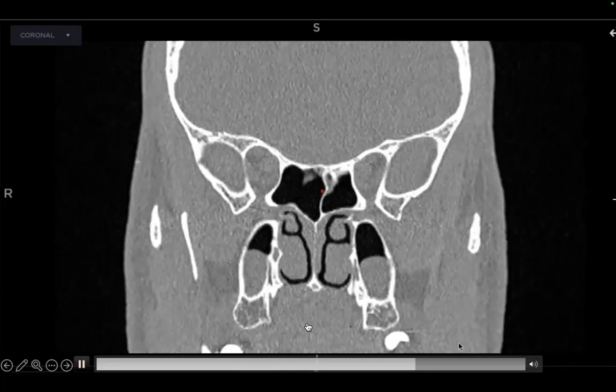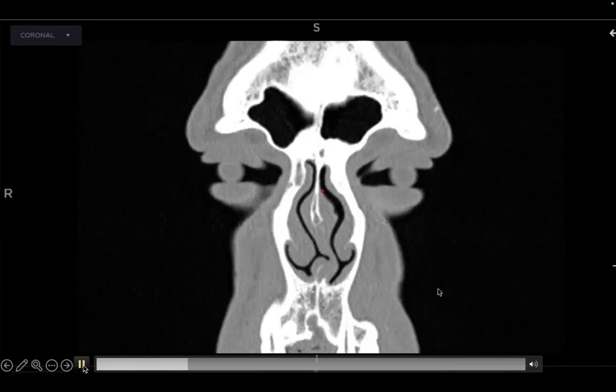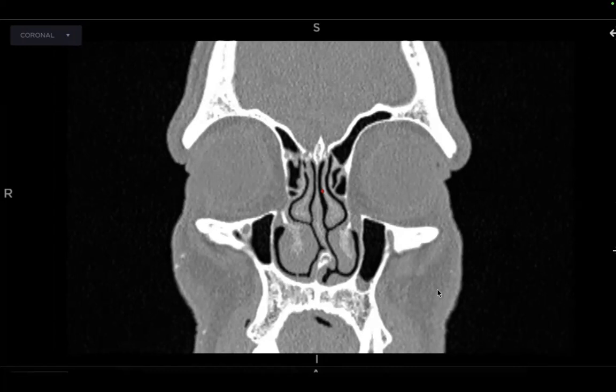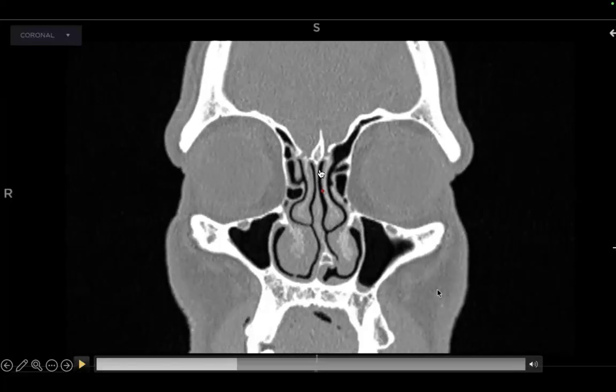And then the last thing, Tracy, is your uncinate process. And we've been through that in a bit of detail. And as we're getting short on time, I won't go through that in too much further detail. But if you see this, there's your uncinate, there it's starting up. And you see very anteriorly that recessus terminalis, where it joins the orbit, is actually part of the agger. It's the agger that goes back and makes the recessus terminalis. So that's very important for you to understand. And then as you go a few cuts back, you see it turns in and gets into the orbit. Here, it sort of turns in, there's a little break in it, but it turns into the orbit. So this is your recessus terminalis.